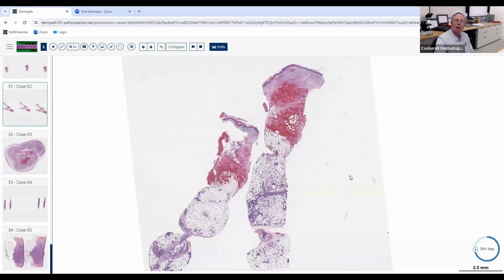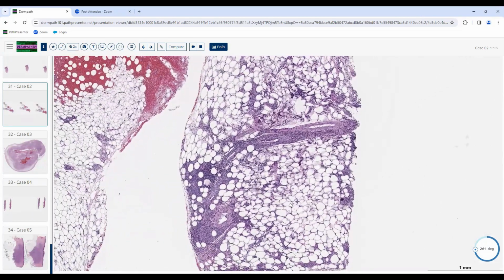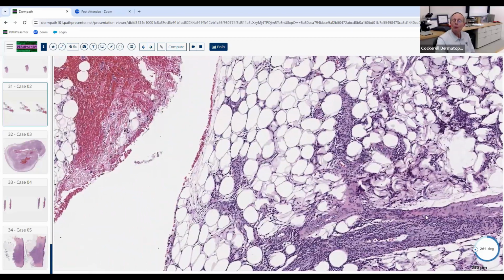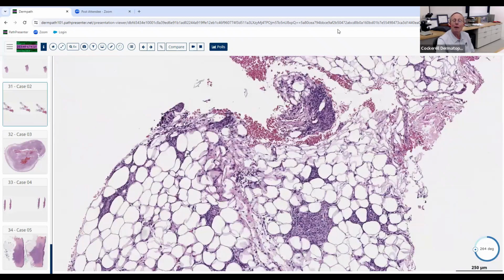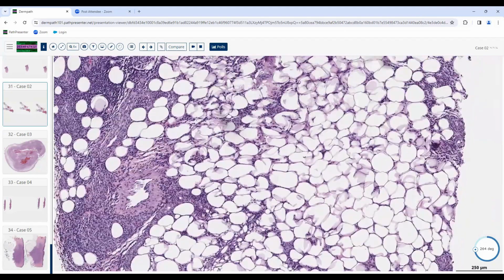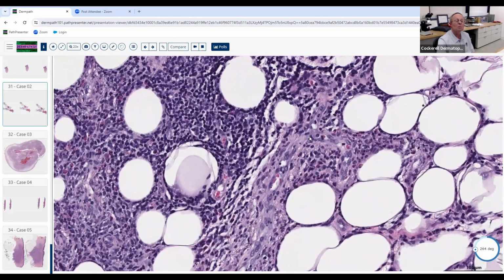Okay. So where's the main pathology, or why am I showing it to you at such a low power? Septal panniculitis. I see some inflammatory cells. Okay, it's a panniculitis. Good. And you think it's septal? Well, I see some cells between the fat cells, but mostly septal looks like in between the lobules. Well, it's definitely septal, but it's also definitely lobular, right? So it's got a lot of lobular involvement also. So it's septal and lobular, but it's mostly lobular, I would say. Okay, so what's the next step we ask ourselves when we're looking at panniculitis?